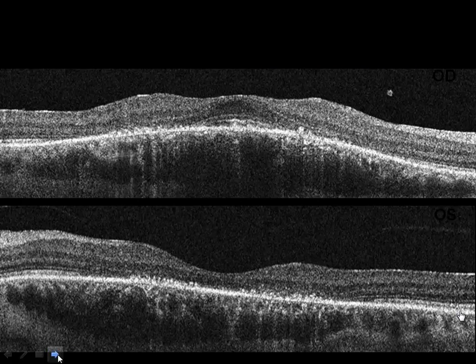Well, something is going on here. Let's again look at the PIL. We're at the fovea in both eyes. PIL is present over here. And then it's poorly defined, and then it sort of disappears. Comes back over here, and comes back over here. In the other eye, in the left eye, we can see that there's really no PIL present here. It's disorganized here. It's disorganized here. Here it's present, but poorly formed, and here it's present, and not very well formed.